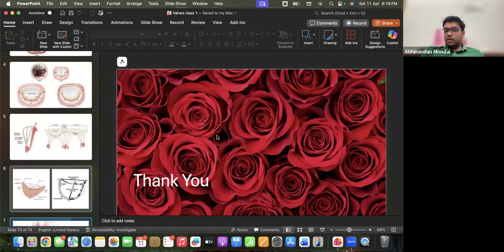And also remember, while doing your 2D examination, if you see any thickening of your leaflet, any calcification of the annulus of that particular leaflet, that means that leaflet is likely to be less mobile. So it is not a particular view that is important. You have to see all the images. You have to understand the pathology and physiology, how the leaflet dynamics are actually moving.